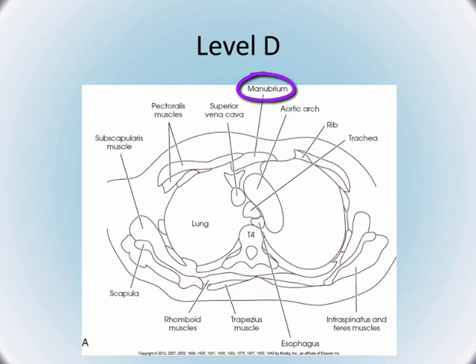One thing to keep in mind with these structures is that lung and the trachea, which have air, are going to be black. As we talked about before, your muscles are more gray, and then any item that's going to have contrast medium or bone is going to be white, to kind of keep you up with that idea of what types of structures we're looking at.